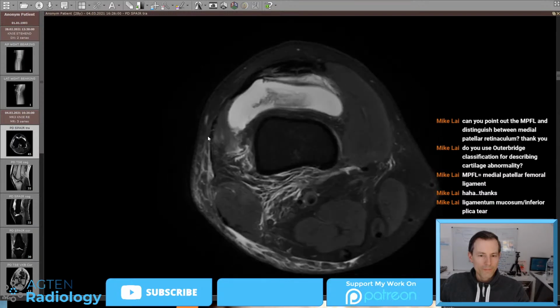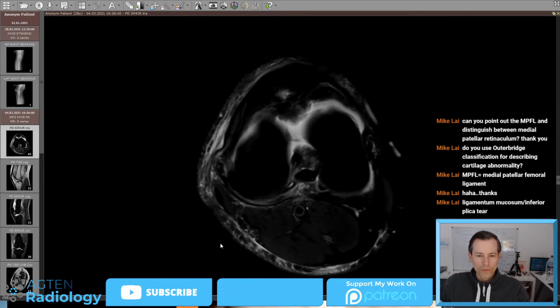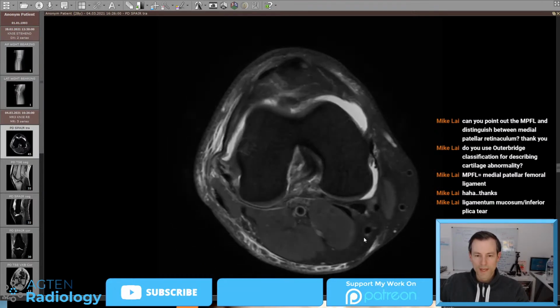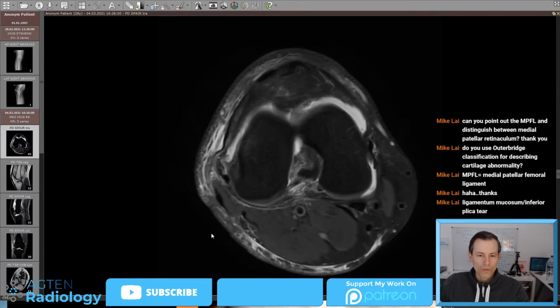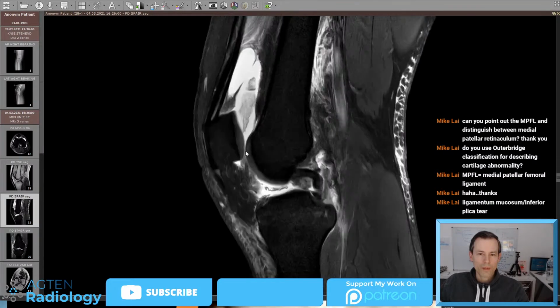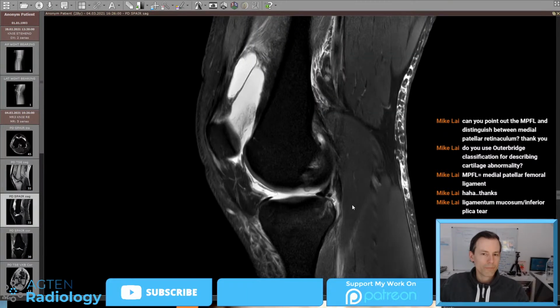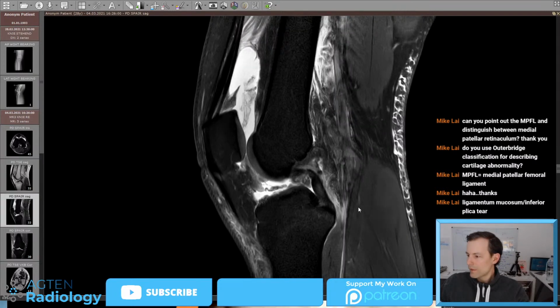Okay, basically that was the approach for the knee. The last part is normally to have a look at the popliteal region of the joint, anatomic variants with the gastrocnemius heads, accessory muscles or anything like it, Baker's cyst I already mentioned, also the tibial nerve. Just go through this. Maybe just one thing. Sometimes you have a lymph node up here, which is completely normal. This can be confusing sometimes. But I think that's all I got here.